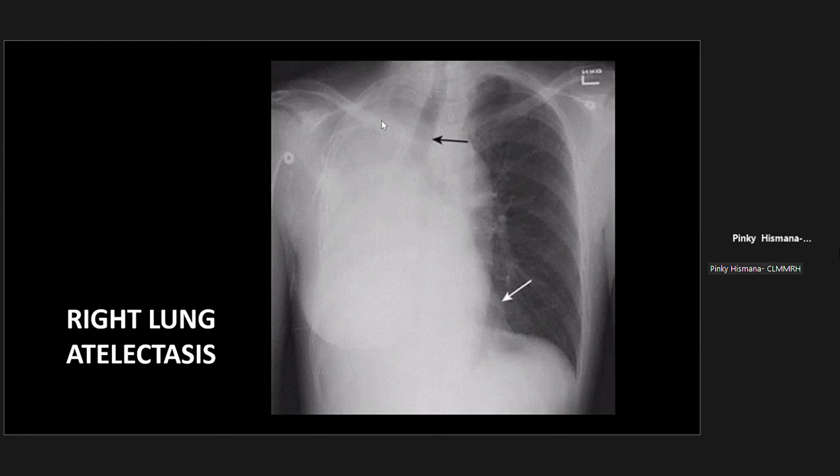Okay. Then the problem here is we have your right lung or right hemithorax is basically completely, we actually call this white out. So basically, you find an opacity which encompasses almost your entire right hemithorax. What do you think is the problem here? What are other problems that you can see here other than the tracheal deviation to the right and the opacity at the right hemithorax? Can anyone help? But at least, good points.